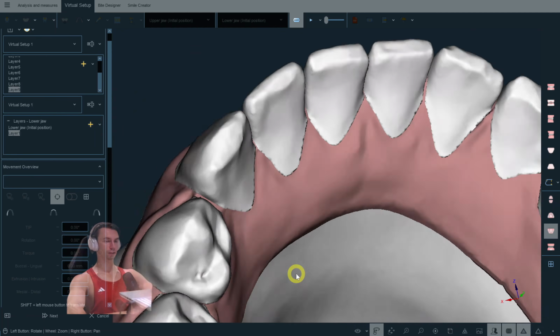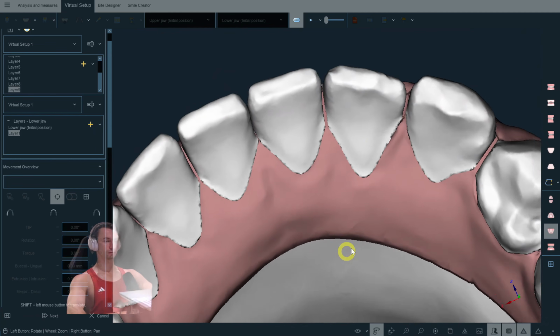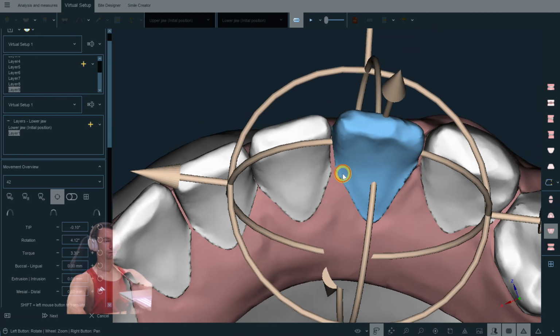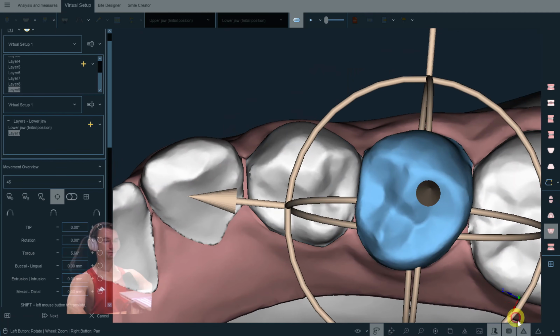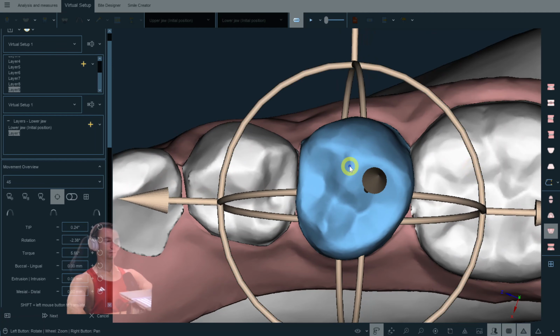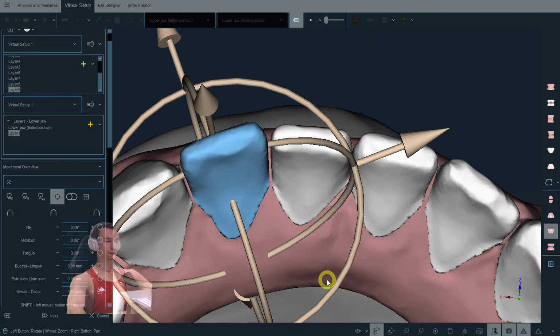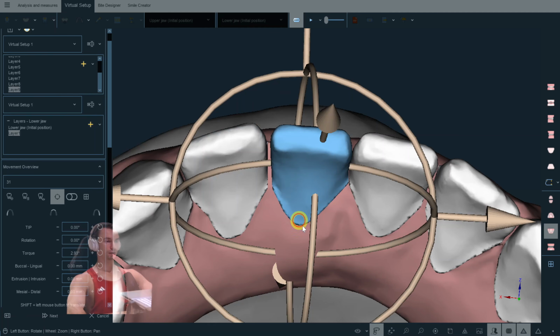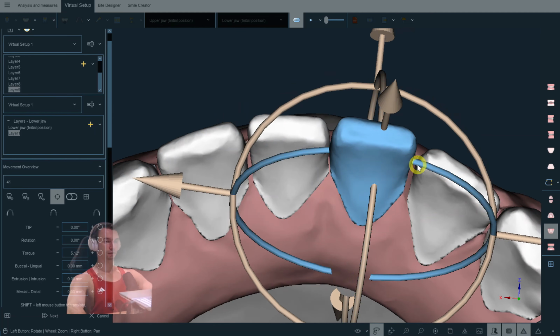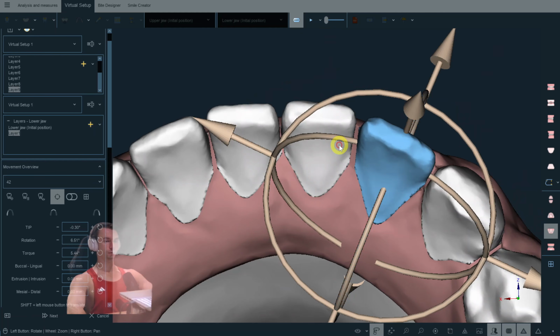I mean, with clear aligners. With other techniques, there are other possible outcomes, but here, if you're trying to fix this rotation, not sure it's gonna be stable. And the most important is that there's just no sense from the aesthetical point of view. So here is what I always do.